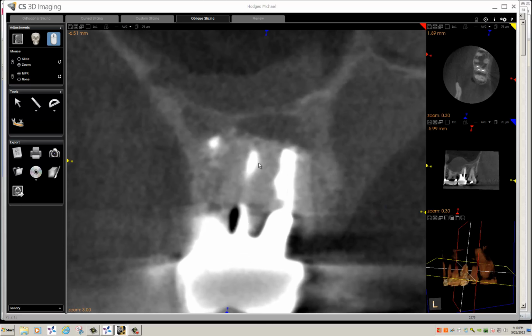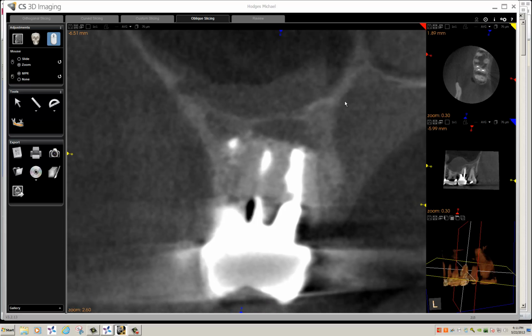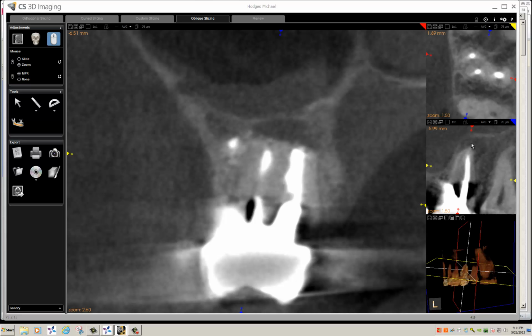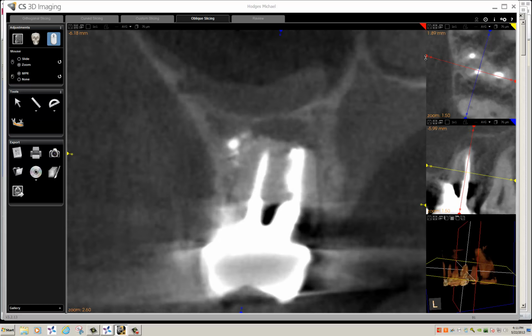The left or the scroll, you make it larger, and then you go up to each of these individual smaller windows. Using the scroll bar, you zoom that up as well, and in each of these different quadrants you can manipulate the axes and change the view so that you can get it kind of exactly where you want it.